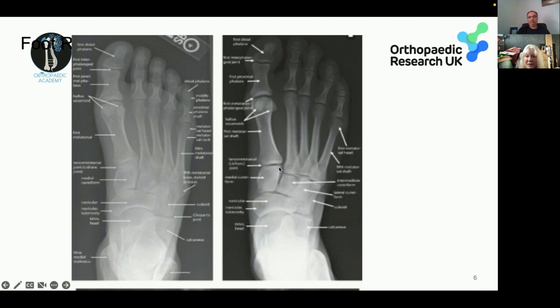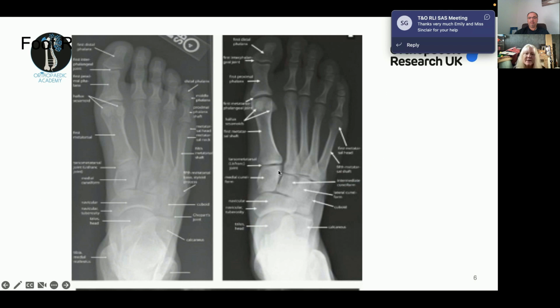See how the medial one projects up like this, and then there's kind of a little slot for the base of the second metatarsal to slot into, and then you go along the lateral down to the cuboid. All right, and there's an important ligament that goes from the medial cuneiform to the base of the second metatarsal, which holds this all in place, and it holds it in place in 3 planes.